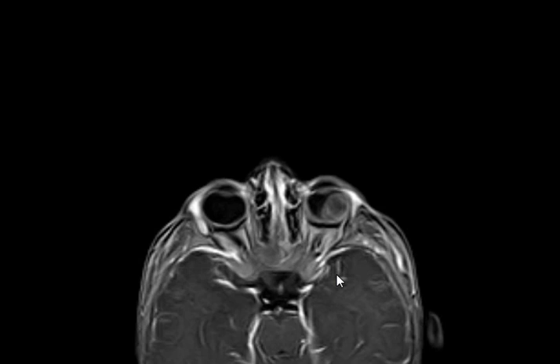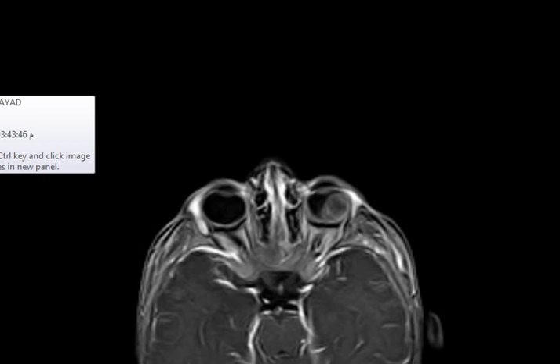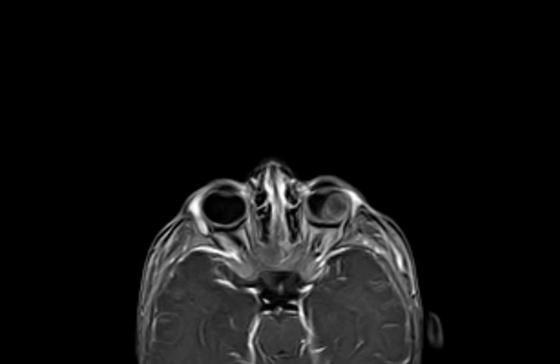So, now, what would you like to do? If this child was in your clinic and he's sedated, he's in the machine, that's it? You say to the anesthetist it's finished, or you would like to do something else? Okay, diffusion and ADC, what else? Let's see, is there any diffusion? I don't think there is any diffusion here. STIR, we have STIR. What else would you like to do? Something that helps in your diagnosis.